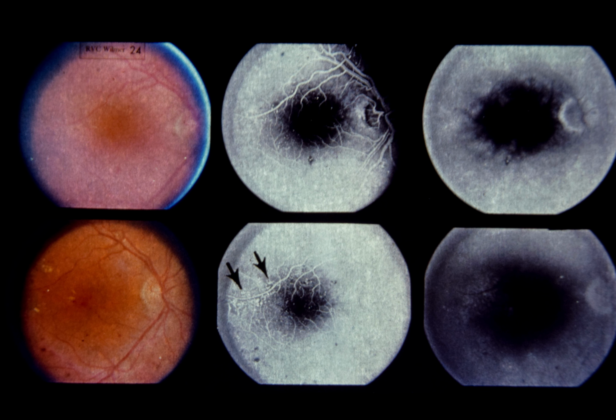2 years later, this patient complained of metamorphopsia in the right eye. Visual acuity was now 20/25. Lower left, note increase in lipid deposition and in number of microaneurysms and dot hemorrhages in macula. Lower center, 12 seconds after dye injection, note hyperfluorescence of microaneurysms and intraretinal microvascular abnormalities, particularly along superotemporal branch vessels, corresponding to area inside lipid ring seen on color photograph. Lower right, 20 minutes after injection, note cystoid maculopathy.